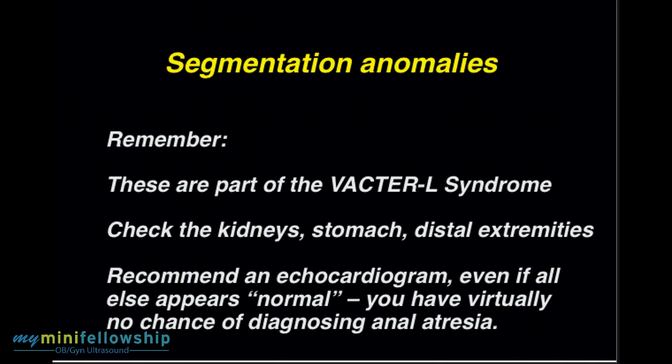So that's something you can do. So again, I think if you see a vertebral anomaly of this nature, you're going to refer it, and you can say referring because of vertebral anomaly. But if you see an abnormal, for example a missing kidney or an empty stomach, look more closely. You sound a lot smarter saying VACTERL syndrome. How bad is it?